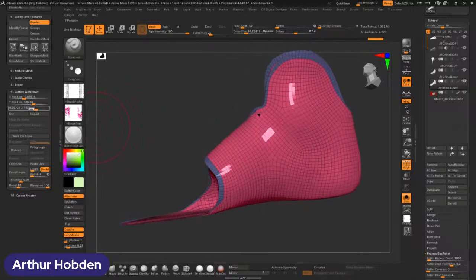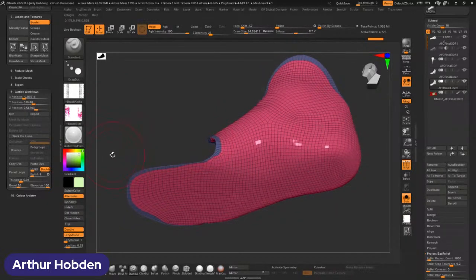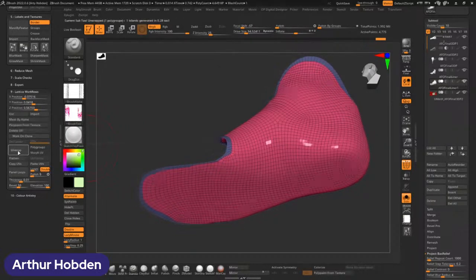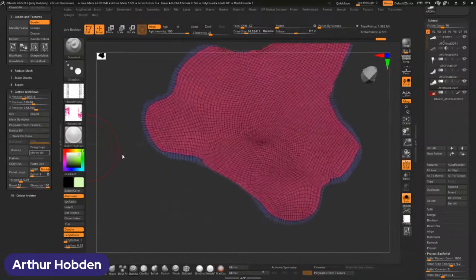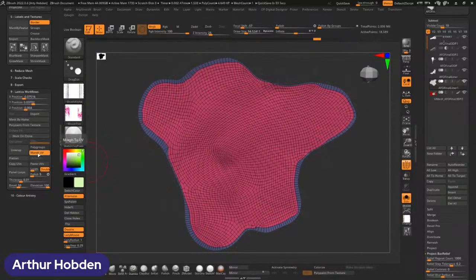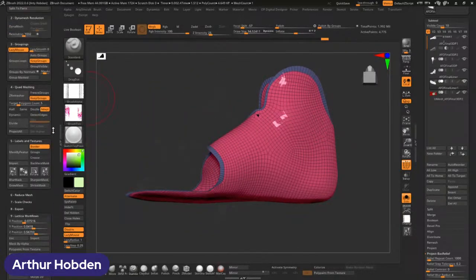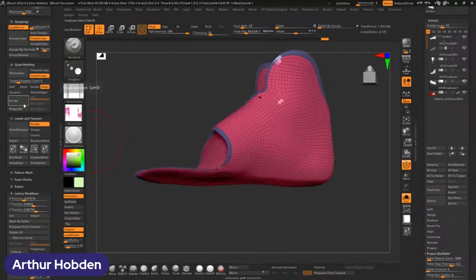There's another way of doing texturing inside of ZBrush where we actually flatten it first and then we apply our textures. So if I can unwrap this and then hit the Morph UV button, you can see what it does. It unwraps that part flat for us, which is really exciting because now if we go back here, you can leave it as a 3D image, but it only has 4,000 points. So we actually need a lot more geometry in order for this to work.